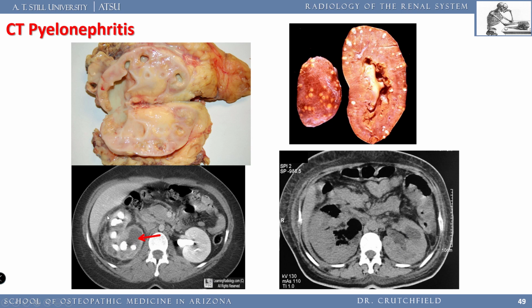They've used IV contrast in this CAT scan because it's lighting up the kidney. There's really no oral contrast that I see. IV contrast, kidney, here's the collecting system, here's pus. And this is what it looks like. Good old-fashioned pus. You open up the kidney, and there it is. Here's collecting system that's dilated. It shouldn't look like this.